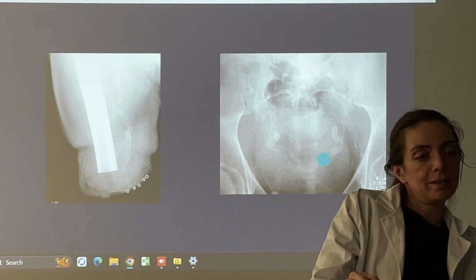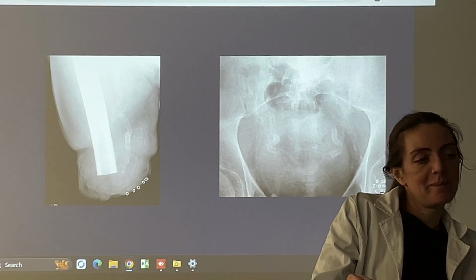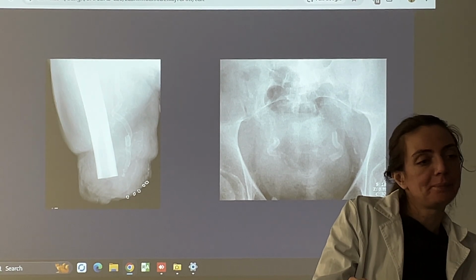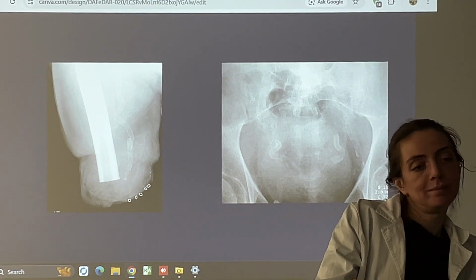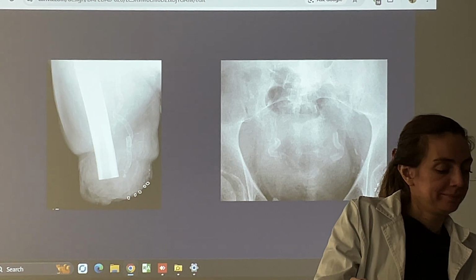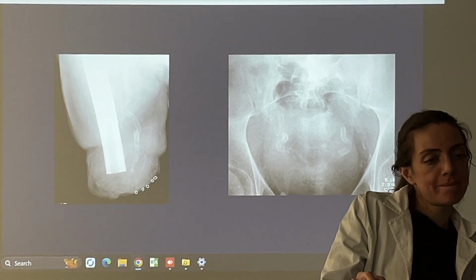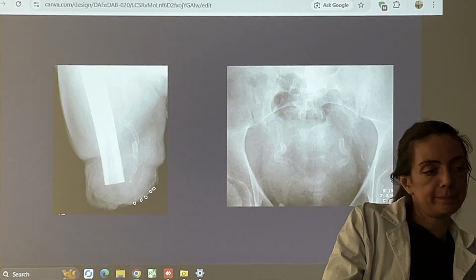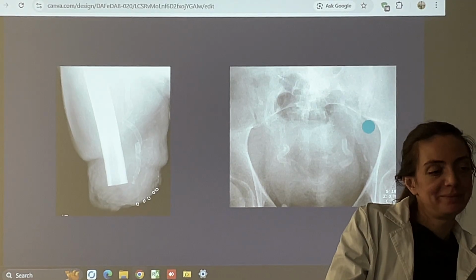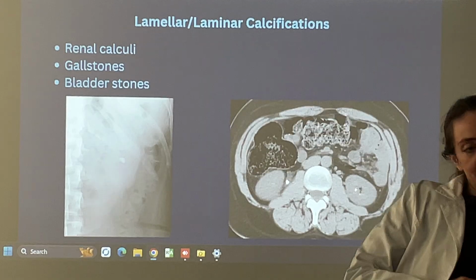What else can be this one? If not urethra, if it is male, what is it called? Vas deferens, it is called.